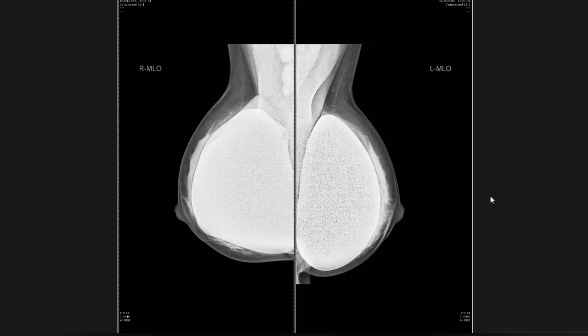The surrounding skin appears normal to me, that it is not inflamed. However, some fatty strandings are evident in the form of haziness. In my provisional diagnosis, it is a rupture of the silicone implants, likely extracapsular.